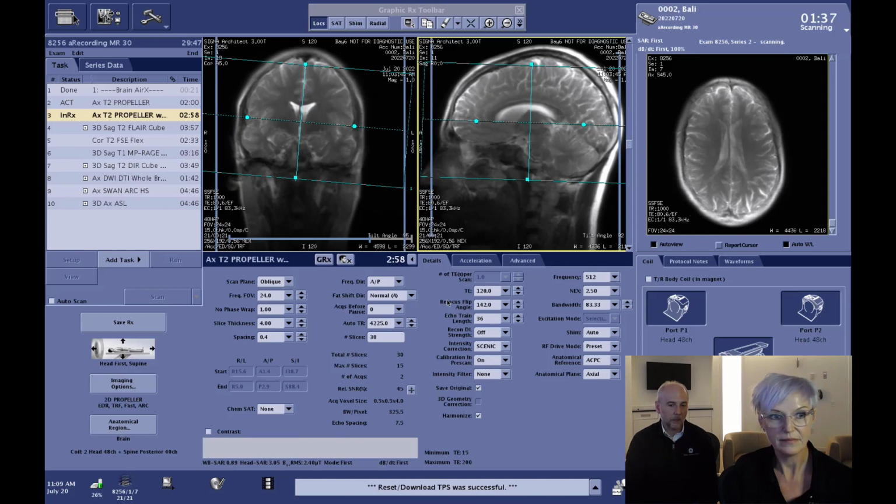Yeah. One other option I think people were doing before is they would reduce the resolution, right? So reducing the resolution improves the signal, but the quality of the image is obviously not what you want for that. So we want to acquire true 512 imaging, and this gives us this capability here.